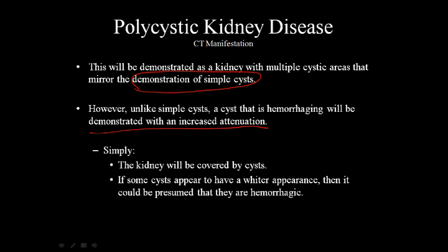So you're going to see an increased attenuation, meaning that a cyst that is experiencing a hemorrhage will look white or more white than others.